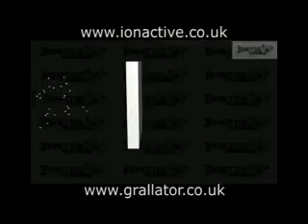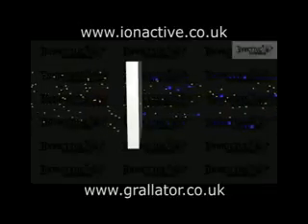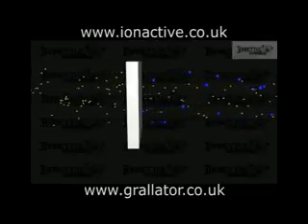When the LINAC is used as an electron source, similar reactions can occur whereby an electron is absorbed and a neutron is released. The reaction probability for this is much lower than that for X-rays.